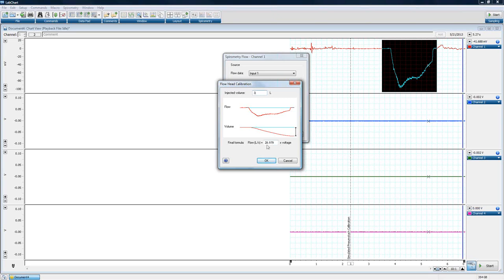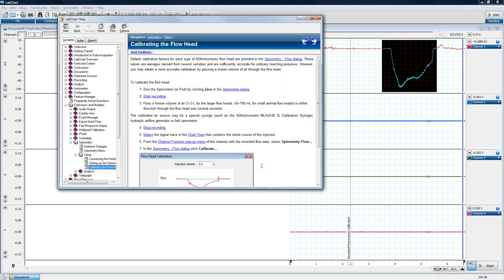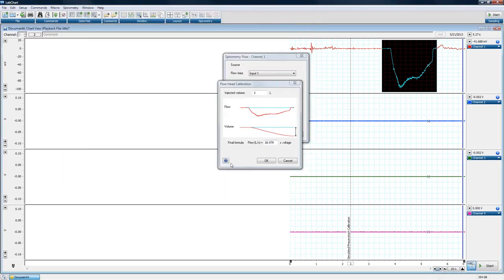If you have any questions about anything, you'll notice throughout that we have these little hot buttons right here that will take you to the help menu topic for that specific window. I would highly recommend using them. If you get lost at all, definitely click on them. Many people have bad experiences with help menus from other Windows programs, say even for Word or PowerPoint.